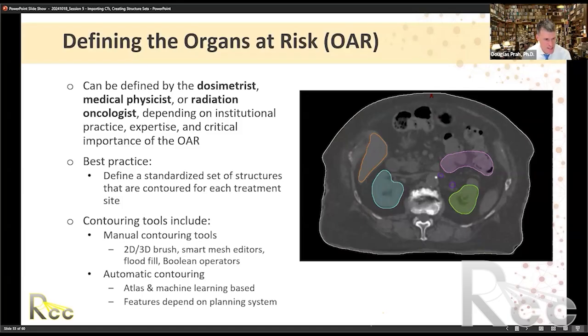So I think if you do not do IGRT, your margin should be larger because you can't verify it on a daily basis. So normally what I do is I look at the IGRT image, I turn the PTV on, and I make sure that the GTV plus that margin that the physician gave, or basically the CTV, is going to fall within the PTV. And if it doesn't fall within, we either have to make an adjustment, or that is an indication that perhaps we need to replan it and increase the margin, right?